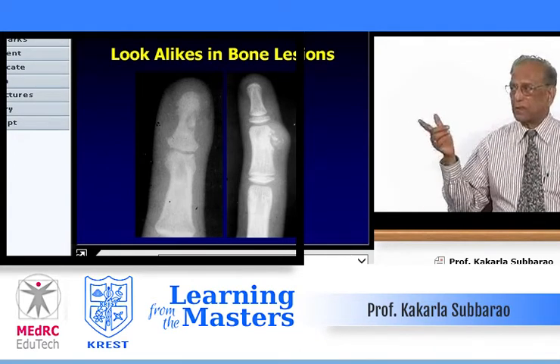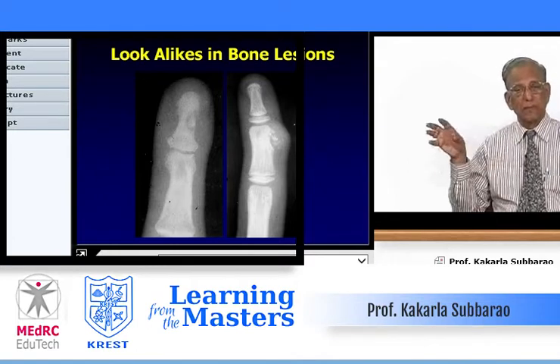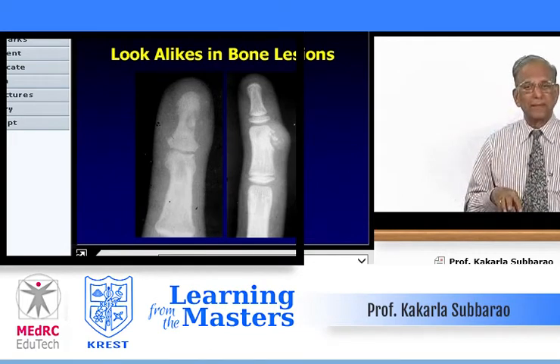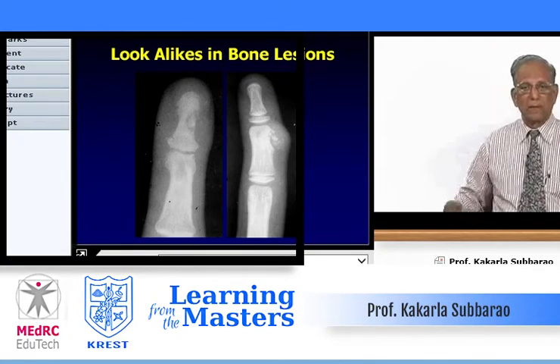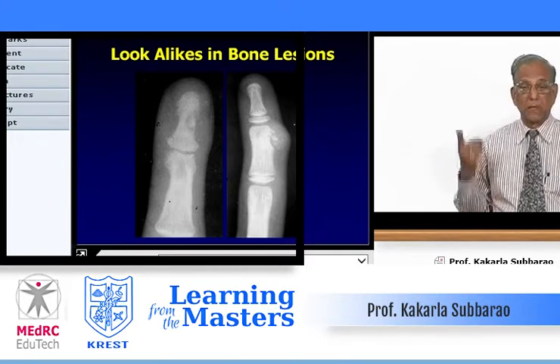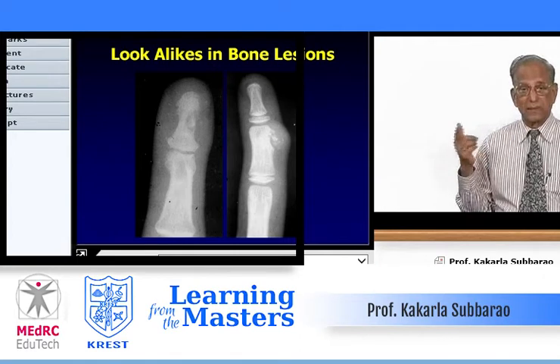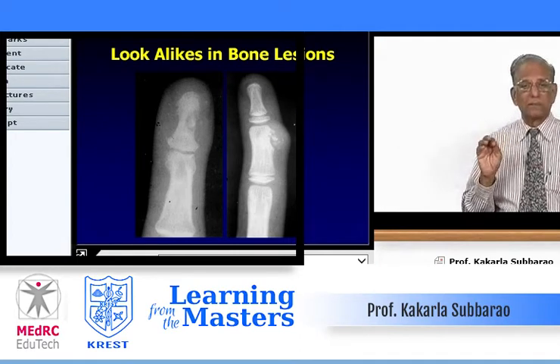And this obviously, keep this in mind, whenever you think of a diagnosis, try to keep that particular lesion anywhere else. For example, keep it in the cortex of the femur or tibia, osteoma, intracortical, not just osteoma, but osteoid osteoma. That's why it has the central nidus, cortex is broken. Because of the hypervascularity, you can get localized clubbing.